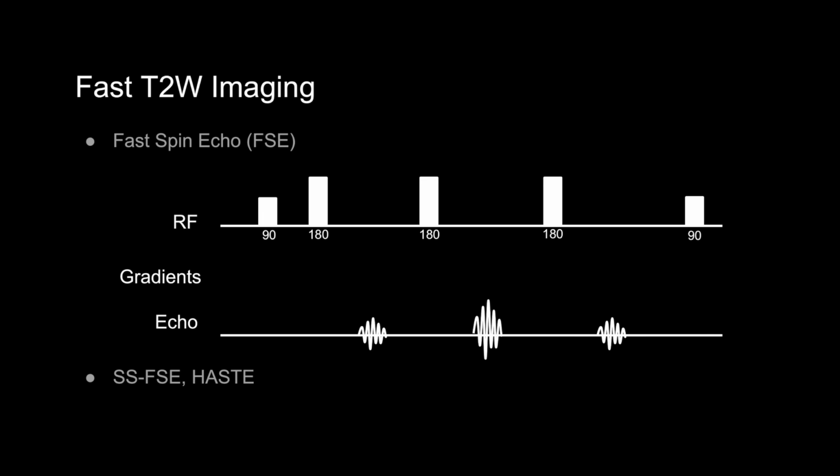You can also have conventional fast spin echo images that can have better contrast and resolution if motion artifacts can be reduced. So a lot of protocols will also include a traditional fast spin echo. There are also certain artifacts that you can avoid, but that's, again, beyond the scope of this introductory talk. On these T2 weighted fast spin echo sequences, remember, fat is going to look bright, and that has to do with the multiple 180-degree pulses. The mechanism is beyond this talk.